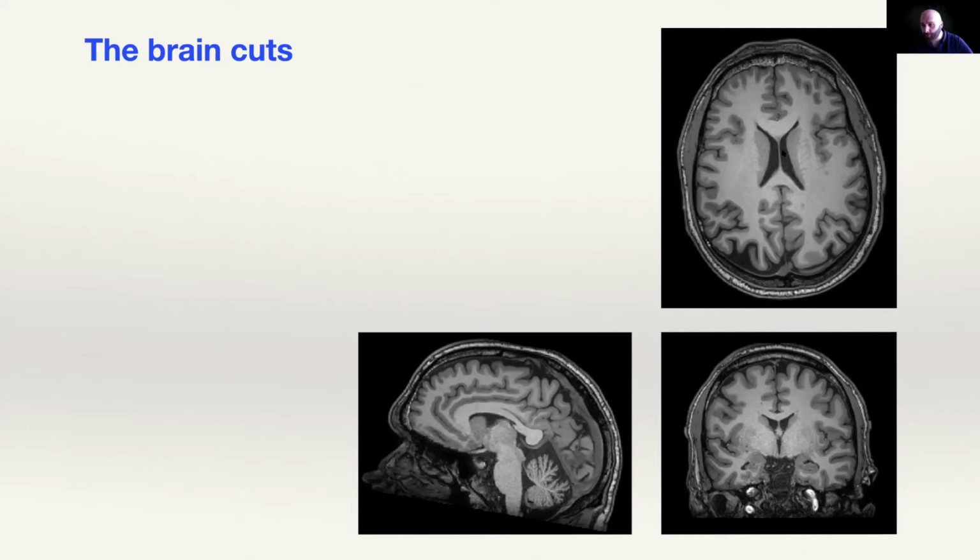So the ventricles that you see here are also here in this left view of the brain. And this one is a front view of the brain. So you see the ventricles here. You see the spine here. You see the spine kind of here. You see the carotids here. So that's pretty much a big picture of the brain. And here you have the skull.